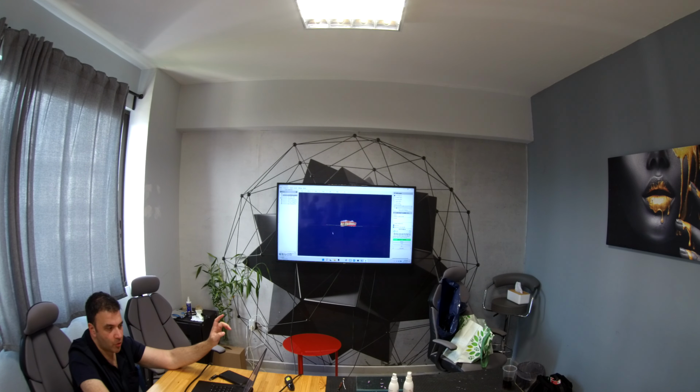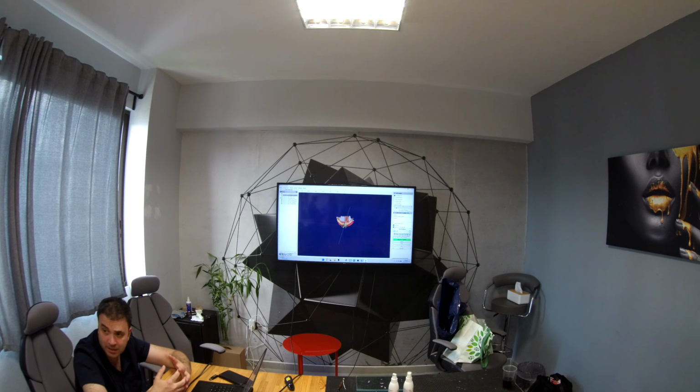Good. So that's why the distal part of the fork, the T-line here, and the buccal surface of the teeth that you scanned with the fork is important, because that will help you to do this alignment. For example, if we don't have it, I could do alignment just in occlusion, like here.